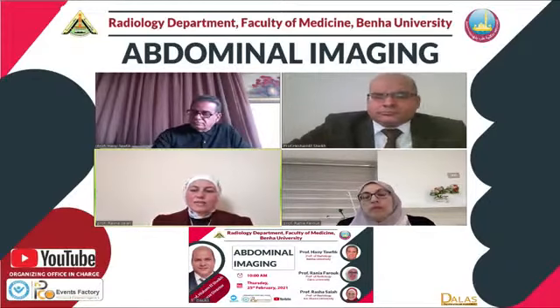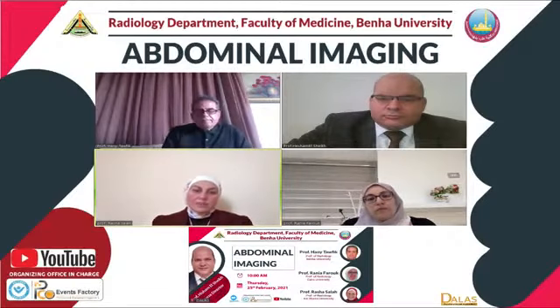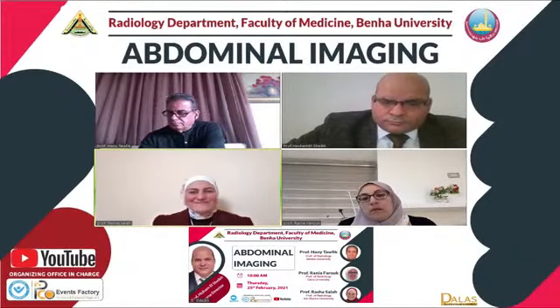احنا مشكلتنا كلها بتبقى في البوست تريتمنت اسسمنت، لان ده الريكتم كله بيبقى ثيكند وادامتس نتيجه الراديوثيرابي، بيبقى عامل سيفير بروكتايتس، ولو العيان ده كمان ريسبوندينج فالماس بيبقى فانيشنج ماس تقريبا. فلو ما عندناش انيشيال ام ار اي هي دي اللي بتبقى المشكله شويه في الاسسمنت للبوست تريتمنت ريسبونس يعني. لكن initially غالبا ما بيبقاش فيه مشكله لان معظم البيشنتس جايين بفيري هيوج ماسز يعني.